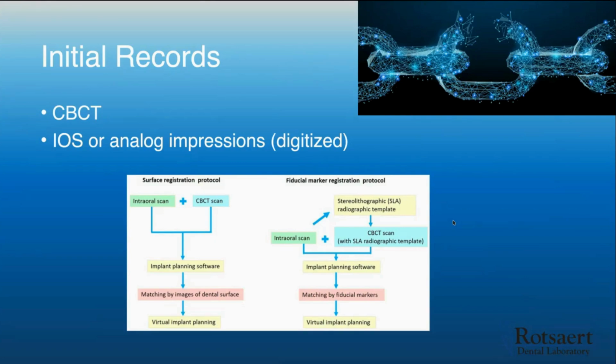So the surgeon knows where you want the screw hole to come out. However, there's no bone data from that. It's really just on a model. So hopefully there's enough bone, and the surgeon, of course, will assess that, or yourself if you're doing the surgery. But we do those every day. As a bare minimum, it's giving some guidance to the surgeon as to where the envelope of the tooth is and where we want that implant to be placed.